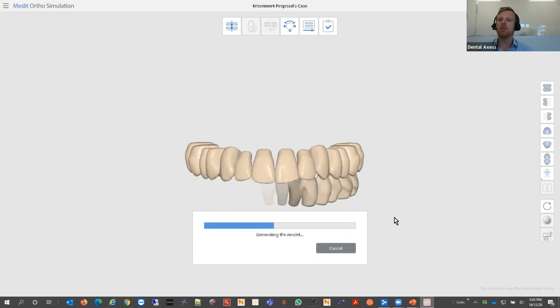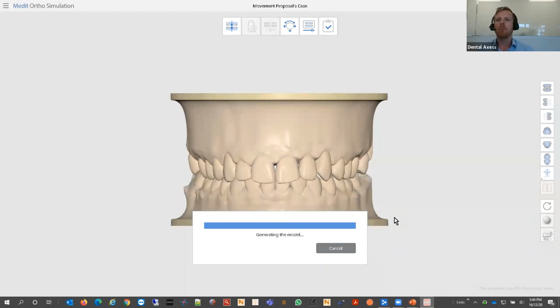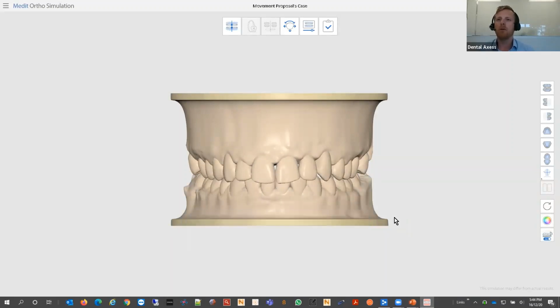Once it's isolated all the teeth, it's going to say, here are my teeth. Let's move them into the ideal position, the ideal occlusion, the ideal movements. And then it's going to present us with this setup saying, here we go, here's what the computer thinks is the best setup. Of course, the way this is working, it's taken thousands of scans and done some machine learning and some other clever algorithms in the background to say, right, let's look at all these cases all around the world, let's see what they look like. And here we go, we've got a model, it's been generated.